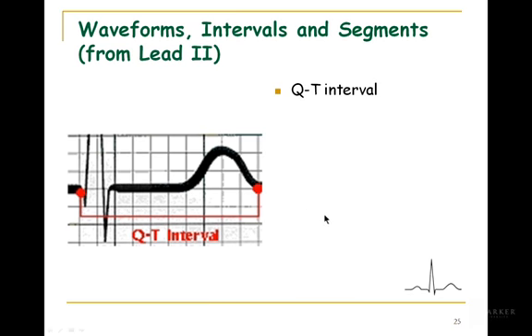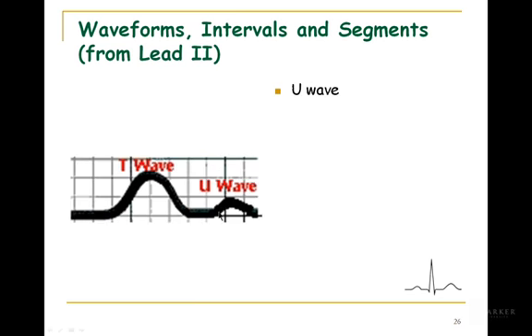Okay. Now the last one is the U wave, and the U wave, we said we could have seen it with hypokalemia, but they call it a wave of unknown origin. It is not necessarily indicative of hypokalemia. Usually, if you start seeing it, it may indicate that part of the ventricles are taking a little bit longer to repolarize, or are a little slower than normal, but again, not very indicative or diagnostic of certain conditions.